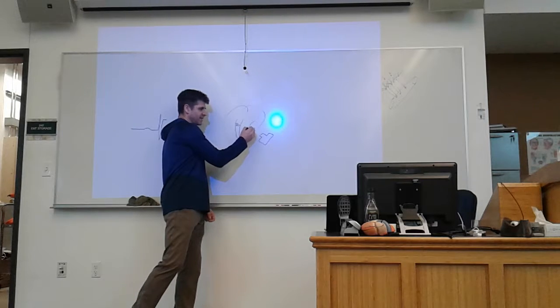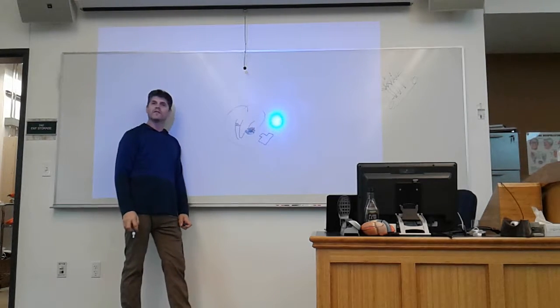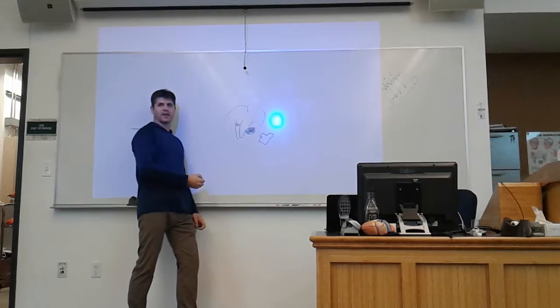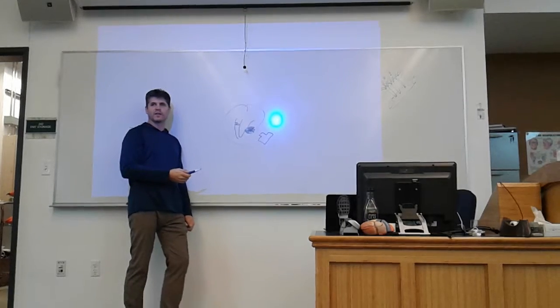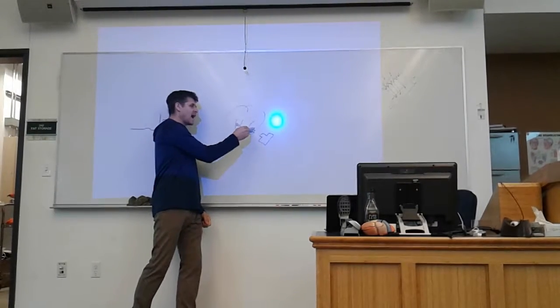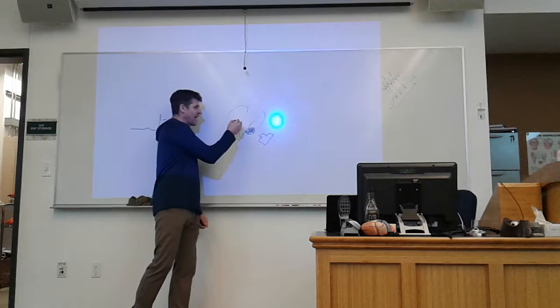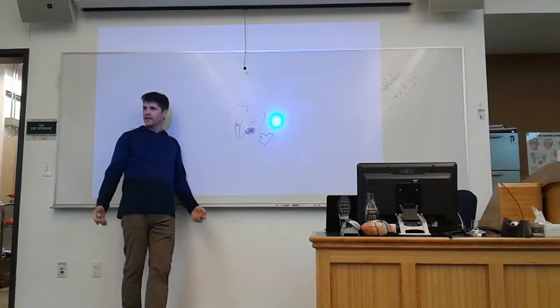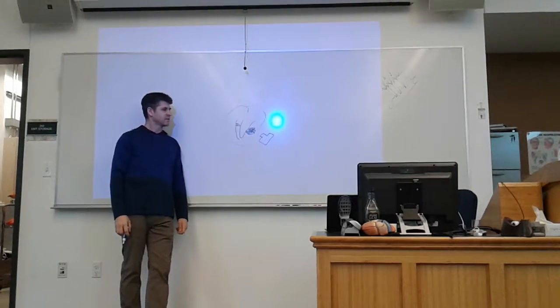This activity would have translated into what on the EKG? A positive deflection. But now, if this is gone, and that's what I see, then what will I see? A negative deflection. In that lead, wherever it is, it doesn't matter where the lead is. At the beginning of your lead two, didn't you? At the beginning.